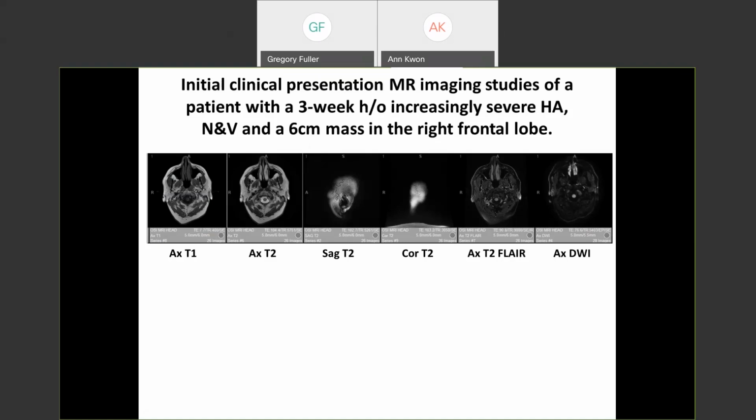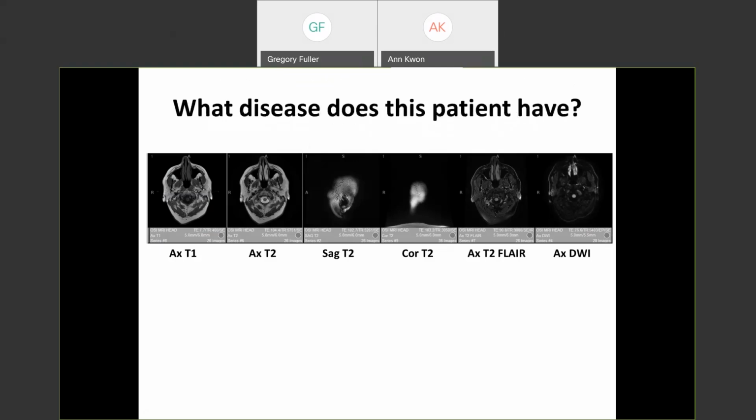And why? What does it tell you about the patient? Now, it's not absolute. I'm asking for a differential diagnosis, I guess, of what's missing, but there's one thing that is absolutely the most common. Which sequence is missing? What disease does the patient have? Anybody? Nobody wants to play? Okay, where's the T1 with contrast?